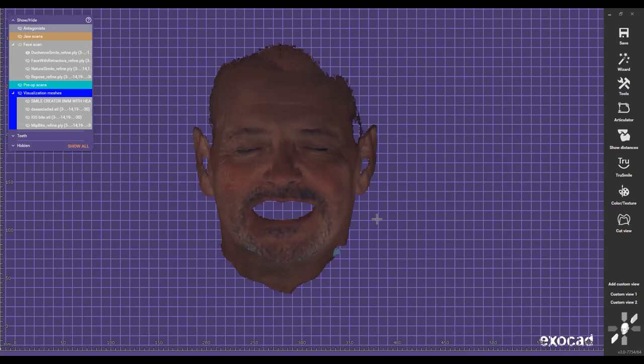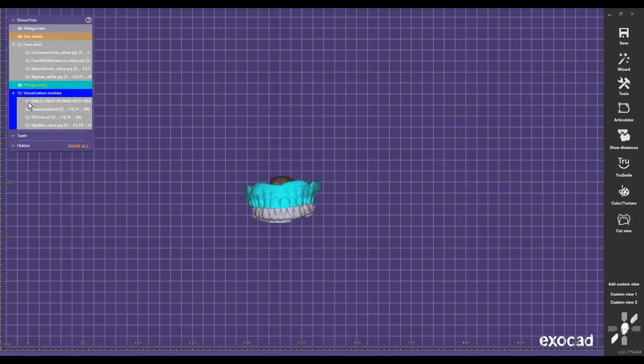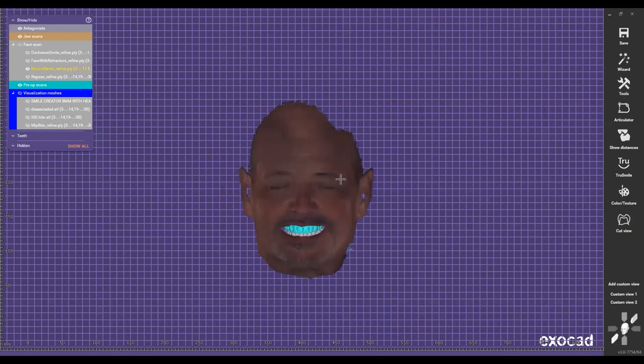So now once we have the scans, here we have everything. We have all the facial scans, we align them. So now it's time for me to start the process, right? We have manuals. I'm the type of designer that likes to create manuals, so that's the way I can teach this, right? And the manuals are basically step-by-step protocols on how to get these cases done the same way for upper, lower, or double arches, okay?